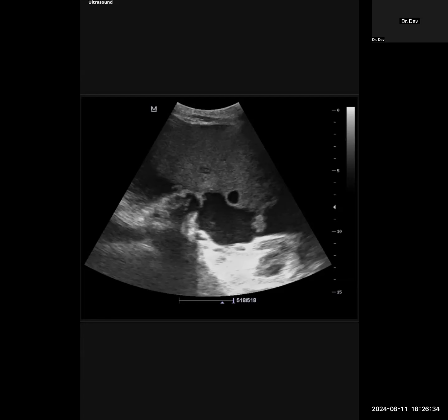In an elderly female, I would like to raise a high suspicion of ovarian malignancies with deposits within the abdomen. Also, a secondary differential could be Krukenberg tumors of the ovaries with a possible malignancy in the abdomen, and another differential could be metastasis of the ovaries. Yeah, Krukenberg metastasis of the ovaries. And I would like to ask for the history of the patient about how the course of this disease was.